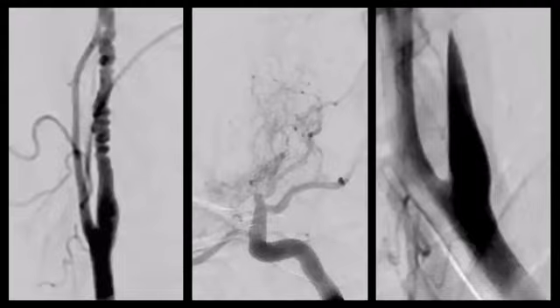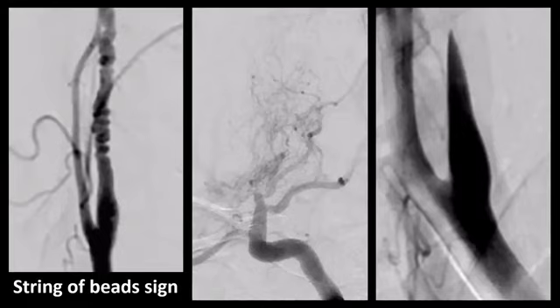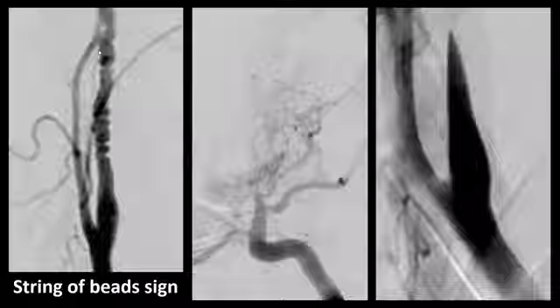And this leads us to something else we encounter in the world of neuroradiological science. That's something that can also be a bit confusing. That is, well, the fact that sometimes the same sign can be used for different pathological entities. Here we see some neuroradiological signs on digital subtraction angiography, and the string of pearls sign, or the string of beads sign, can also be used to refer to this here.